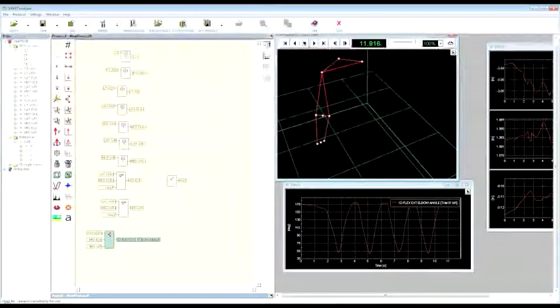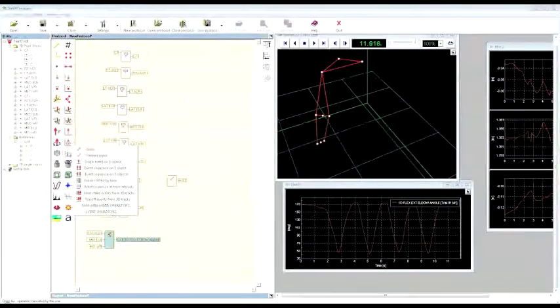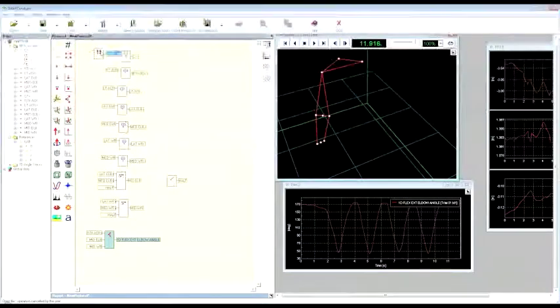Okay, so now we can, for example, continue by computing the range of motion of the angle. That can be considered as the difference between the maximum and the minimum value we have. So this can give us an idea about the maximum movement that this angle can cover. So we can start by computing the maximum over the track of the angle. To do that, we can select the event operator, and then we can choose the option event sequence on one object.